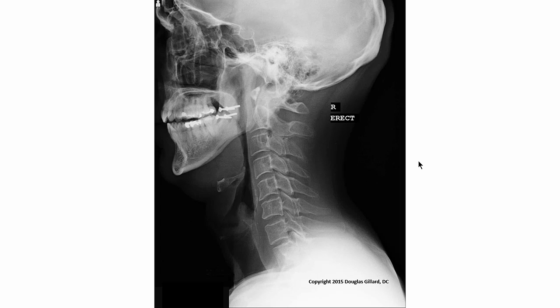Okay, so here's a radiograph of the cervical spine. Let's go through some parts that could be tagged. So here's the atlas. You can see the anterior tubercle superimposed. The anterior arch should be back here. Posterior arch is this whole thing here. Remember, it's not called the spinous process, even though we still call this the spinal laminar line. Here's another spinal laminar line. Another one, another one, another one. That's an important line of stability there.